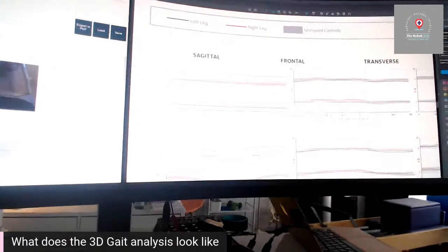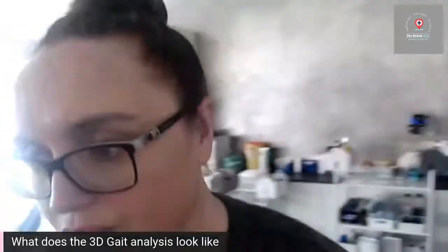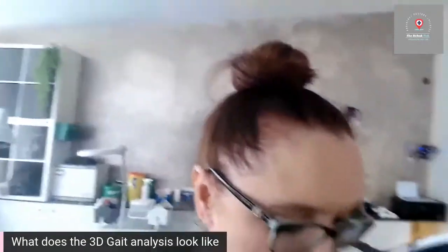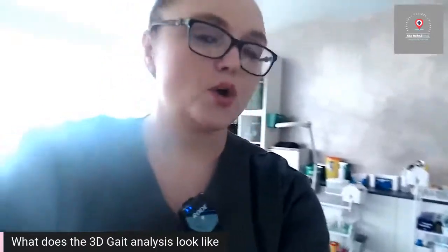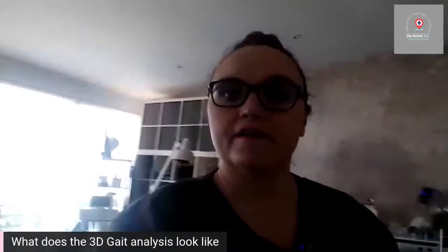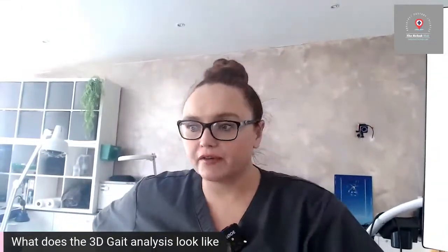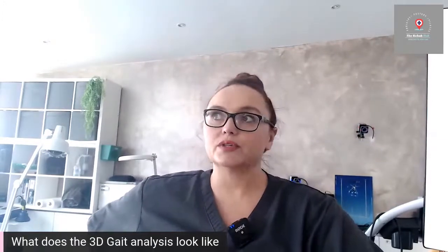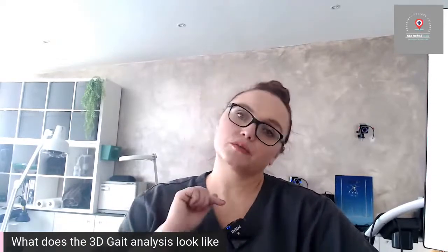So if I just turn this around so you can see me. Ordinarily as clinicians, and I'll bring this around so I'm in the light, when we're analysing our patients, a lot of our analysis can be a subjective analysis, meaning we are maybe watching them walking on the treadmill, or we are filming them. We might be using an app or software. That's quite common for a lot of healthcare professionals or other people working in health, where they'll download an app and it can slow motion down, so they'll be pausing the camera.